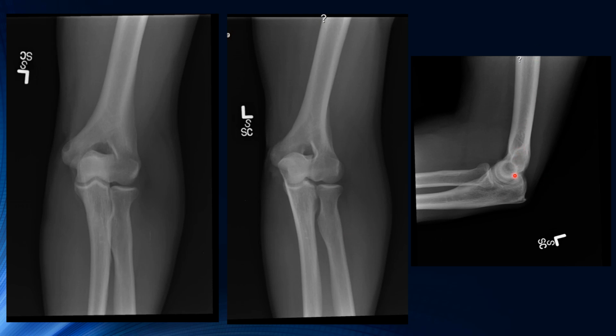Lateral here, it's at a good 90, so you can see your fat pads. We have our 3 concentric arcs here. So this looks pretty nice. Looks like there's some slight, maybe the humerus is a little bit higher than the forearm because this is slightly closed off here.